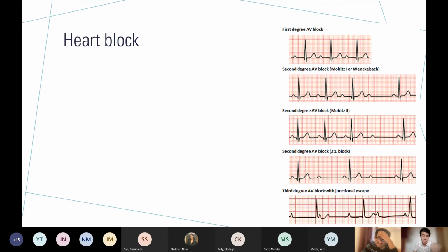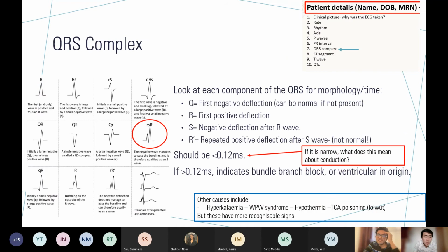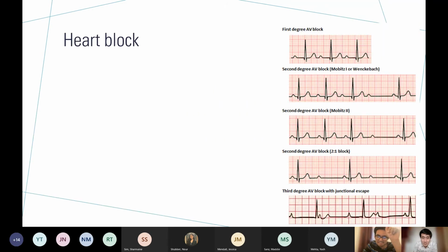You also need to put a pacemaker in third degree heart block. The easiest way to tell if it's third degree is draw the P to P wave intervals and the QRS to QRS intervals, and they'll be regular, but there won't be a relation between them. Cool. Third degree heart block is the hardest thing to confidently say out of all of these. Yeah, doctors get it wrong on a really regular basis. So whenever you get an ECG, mark it out, as James said.